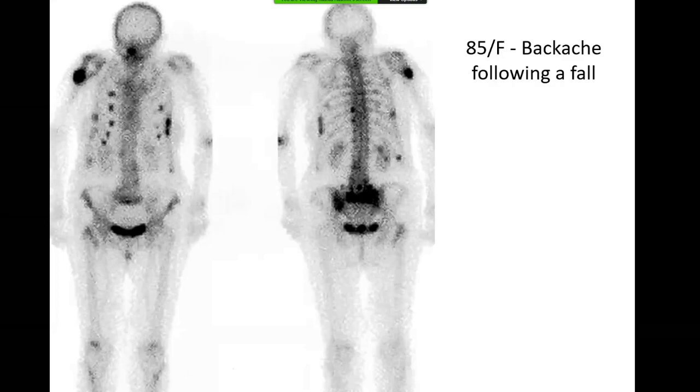So the only abnormality that I'm able to differentiate is this asymmetric uptake in the rib cage, more towards the posterolateral side near the fifth to eighth rib, likely. So it can be due to a fracture, and as it is showing activity, it can be a healing fracture due to callus formation. As the upper limb activity is normal, similarly both epiphyses are also showing normal activity in the upper limb.